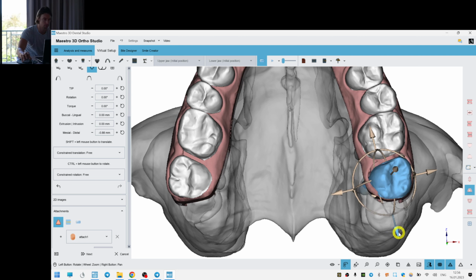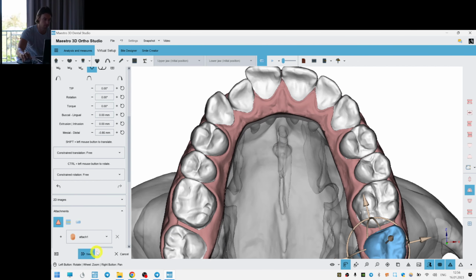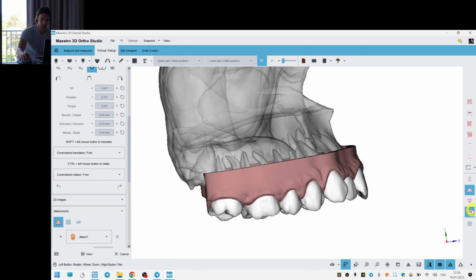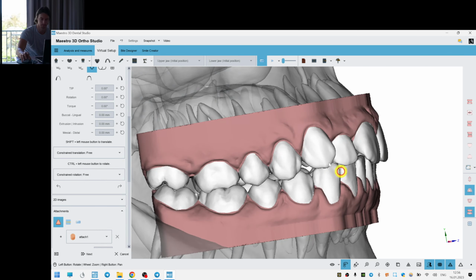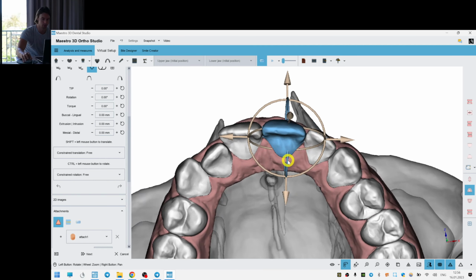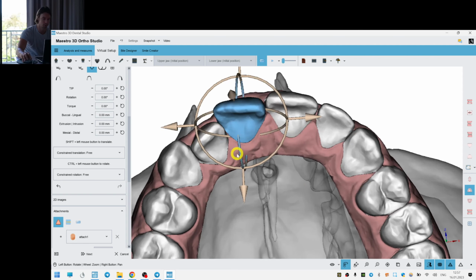About 4 aligners. Ah, no, here we don't distalize. Sorry, I forgot it. So we distalize on the right side. Yep. And we can start moving the incisors, not to waste the time.